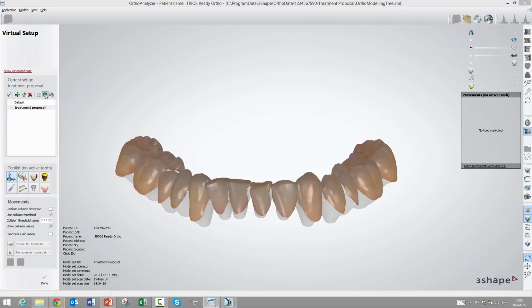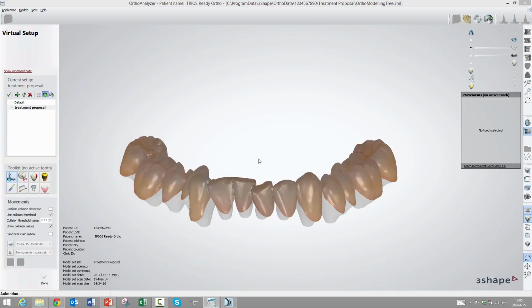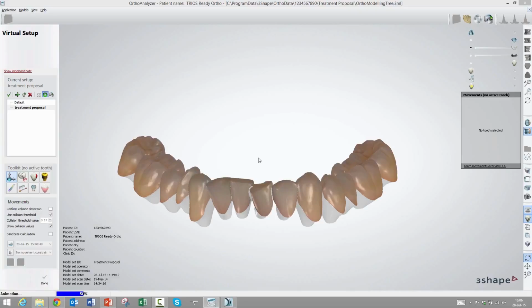I'm going to be able to animate my setup. So basically see what you've done here. So now you will see the setup is going to be animated. Of course, it takes a little while to load it. Okay, that's actually pretty cool. So whatever step you made basically is now being animated. Yeah. So now the whole setup is animated. I don't have any sub setups, which is something we'll look at in another video, but it actually does the division of the movements on screen. So this is great for presentation, of course.